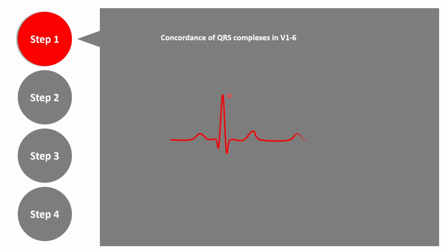This is not, however, true for the QRS complex. In the QRS complex, there is a negative deflection, which is the Q wave. There is a positive deflection, which is the R wave. And there is another negative deflection, which is the S wave. So the QRS complex is both above the isoelectric line and below the isoelectric line. This is called a discordance. So normally, the QRS complex should be discordant, that is normal. If this discordance is absent, that is called a concordance.